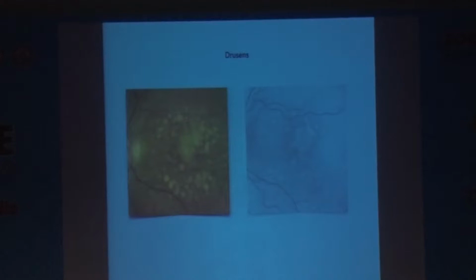Drusen are yet another area where infrared reflectance scores over conventional fundus photography. We need to divide between early, intermediate, and late AMD for prognostic factors, so it is important to quantify drusen. In infrared reflectance, small and medium-sized drusen are mostly hyperreflective, and large drusen or drusenoid PEDs may have variable reflectivity depending upon the amount of RPE above them.